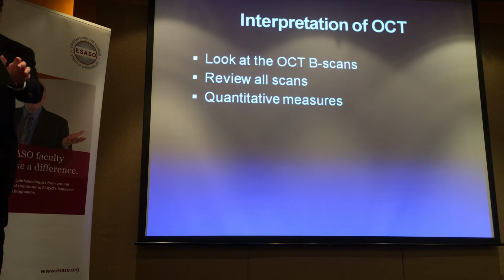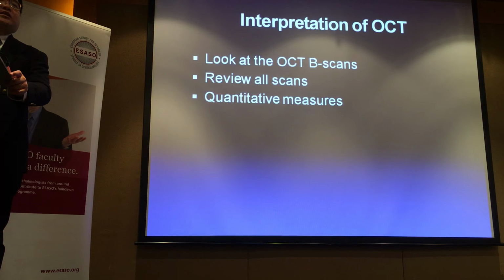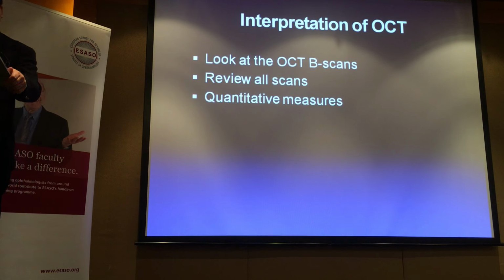So the same thing with OCT. But sometimes you forget or you develop bad habits of shortcuts. Important, look at all the OCT scans. If there are more than one scan done, sometimes the technician will zoom in on a certain area, either by their own initiative or because it's been instructed. But it's very important to look at all the scans. And the quantitative measures, as I mentioned, may or may not be helpful. I think it does give you some indication, but certainly I would not recommend that as a primary consideration in the decision on whether to treat or not.